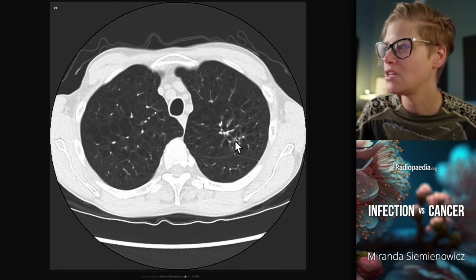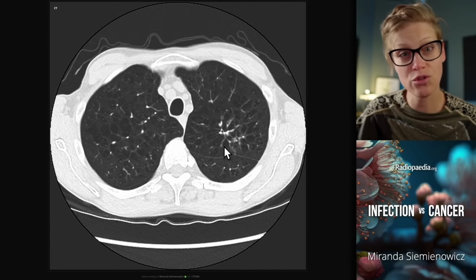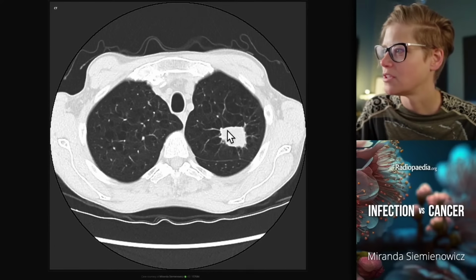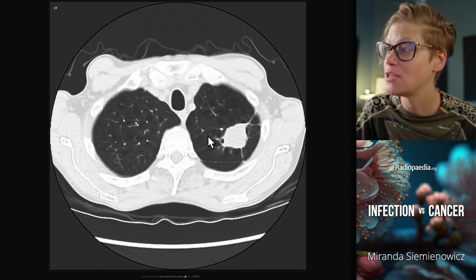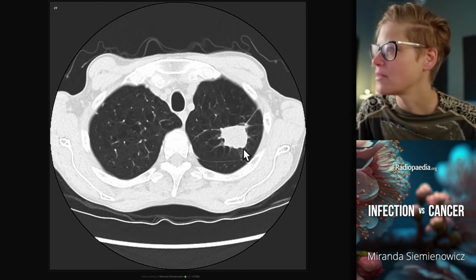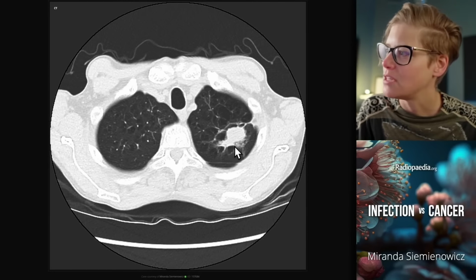These are thickened interlobular septa that are reactive to an adjacent inflammatory process. Let's keep going. Septum, septum, vessel, vessel, coming up into another vessel that is angulated because it is branching. Here we've got a thin inflammatory band extending out to the pleura. And as we keep coming back up, there's a septum, there's a septum.